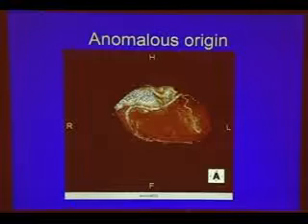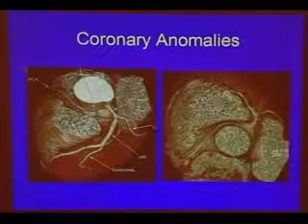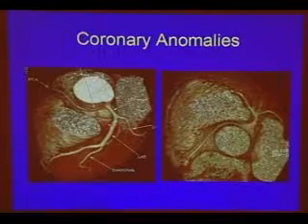Again, this is just a 3D reconstruction of the same anomaly. Here's just another 3D reconstruction of anomalous coronary arteries.